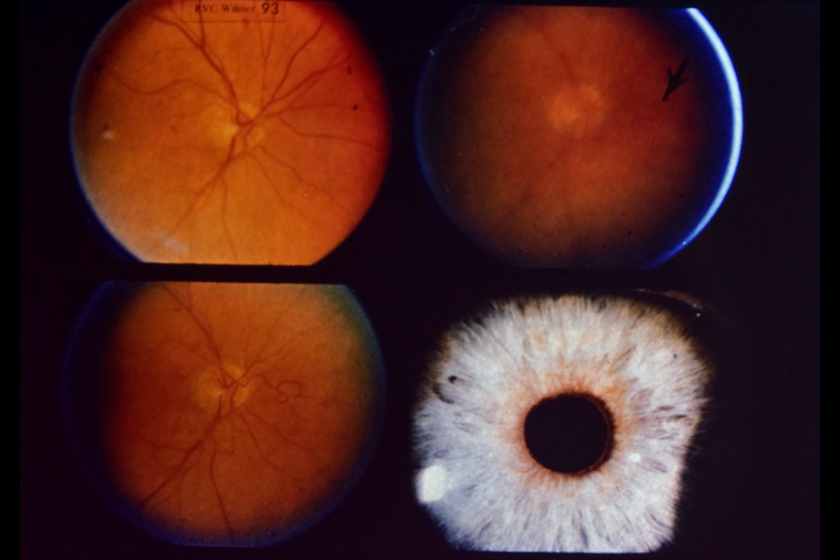At the same time, lower right, note peripupillary rubeosis iridis. Less well seen are the new vessels along the temporal perimeter of the iris. On gonioscopy, vessels were seen to cross the anterior chamber angle. Management of this case will be discussed in the next slide.